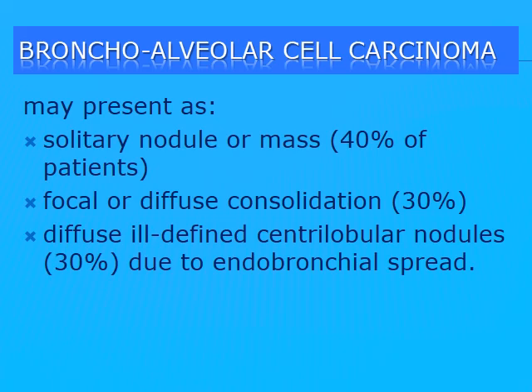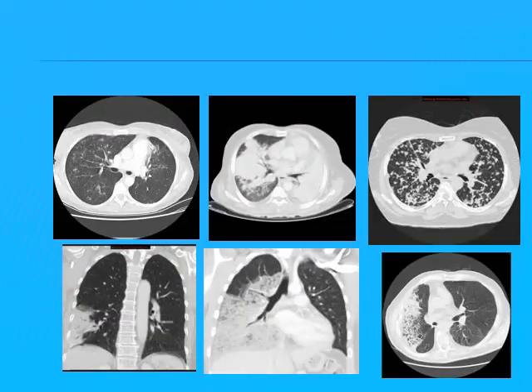It can present by any pattern you have seen. Look for this: nodules, solitary nodule, patch of consolidation, multiple nodules with septal thickening, patch of consolidation, crazy paving pattern, okay, patch of consolidation with areas of air lucency.